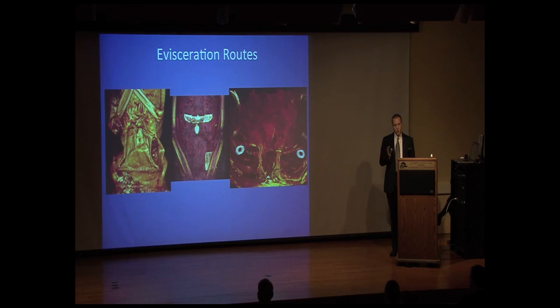The route of evisceration is often easily discerned. The embalming incision on the left abdominal wall is easily appreciable in CT scans. The presence of an incision plate, however, may be the only indication of transabdominal evisceration in plain films. Perineal forms may be substantially more difficult to differentiate with large amounts of resin in the perineum and the compaction of lucent structures, as I mentioned.